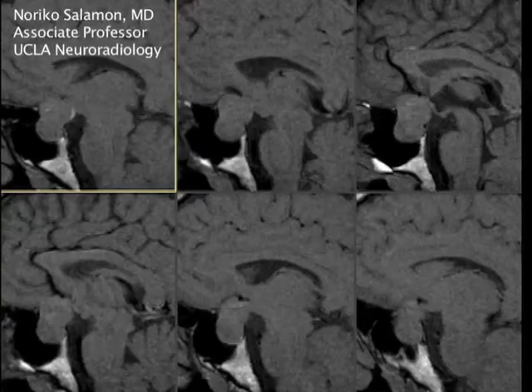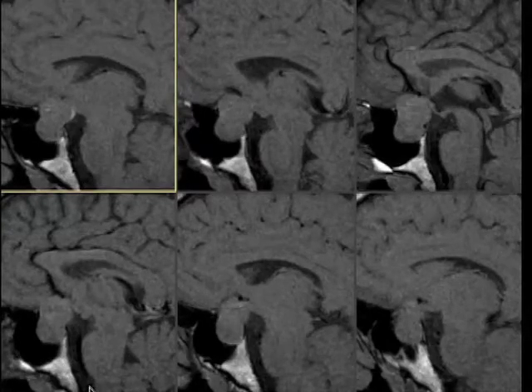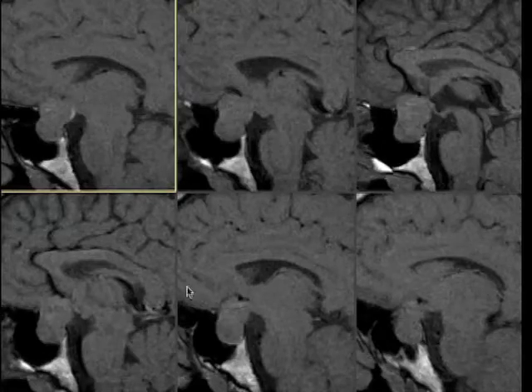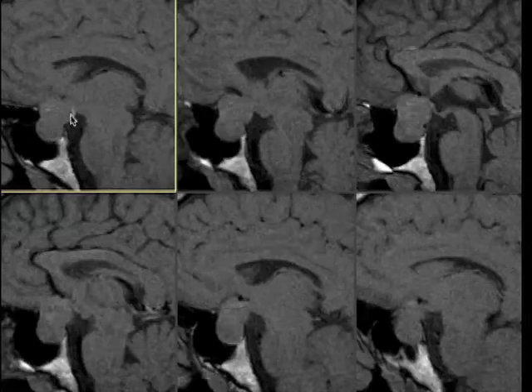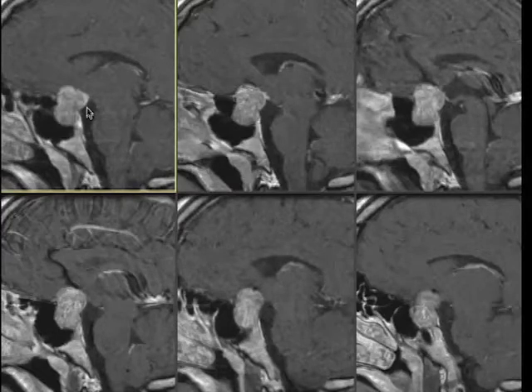This is the surgical imaging MRI showing an apparently large mass involving the entire sella and then extending into the suprasellar cistern. You can see the small hyperintense signal right here, and this may be the residual posterior pituitary. So I'm thinking this is where the normal pituitary tissue is. You can see a little enhancement, which is a different degree of enhancement from the rest of the tumor.